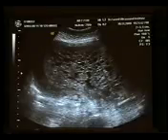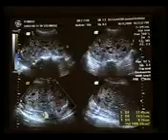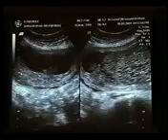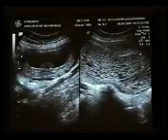Molar tissue in the uterus. This is uterine wall. Some more molar tissue slides, typical. And sometimes, in addition to the molar tissue, we can have an embryo, dead or alive. And that embryo is always abnormal. Molar tissue and also the embryo.